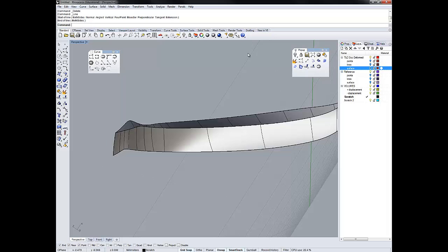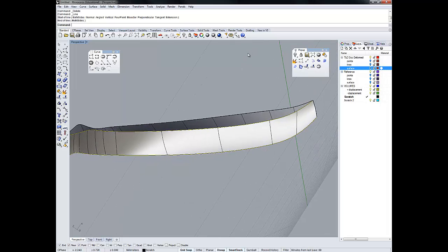Since I have this surface here, this curve and this curve here that is too long, I want to be able to select a line that starts back there and stops here, and a line that starts here and goes over there. So I already have this line, and I already have this line, but I need to cut these two lines right here.